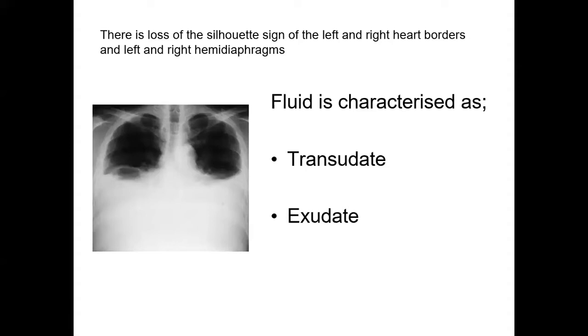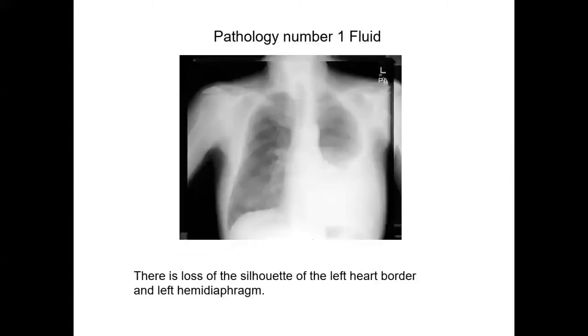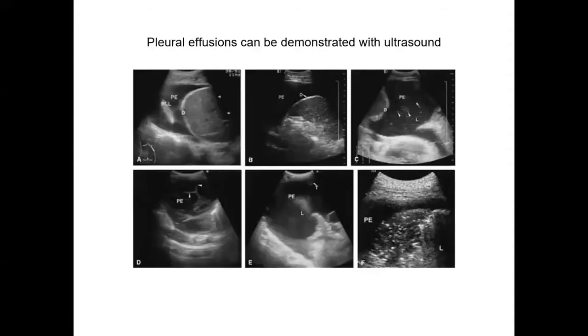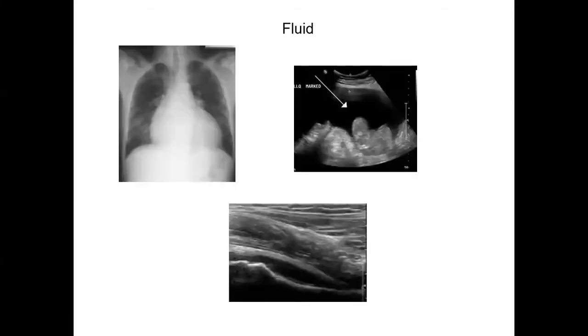And we see a lot of fluid, and it's not just in the chest we see it. We can examine the pleural spaces with ultrasound, which is said to be the new stethoscope. It's a visual stethoscope, and it demonstrates fluid very, very well. In this X-ray, if we used ultrasound, it would differentiate between fluid, consolidation, and possibly tumour by imaging the chest. And let's be honest, it's the same anatomy, same pathology, but different imaging modality. Let's go forward. So fluid occurs pathologically in the body.